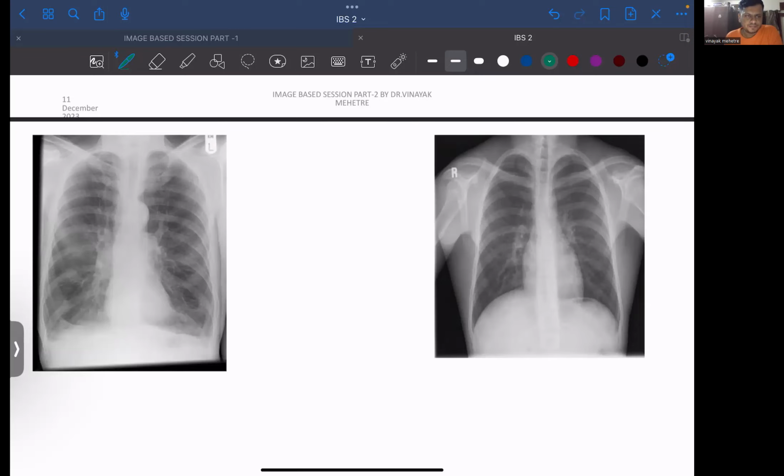All of you are smokers, right? So normal is not normal nowadays. This one is normal. This one is for a COPD patient, right? Sooner or later, your X-ray will become like this. Now tell me, what is the difference between a COPD X-ray and a normal X-ray?